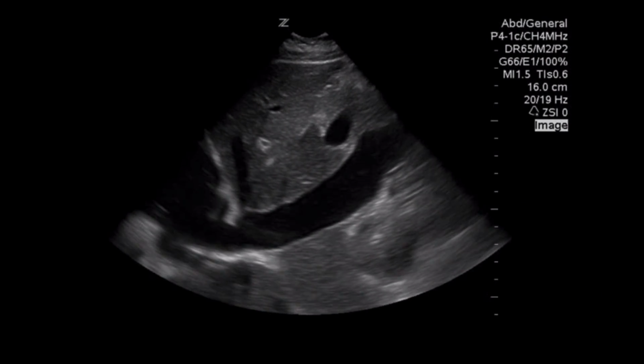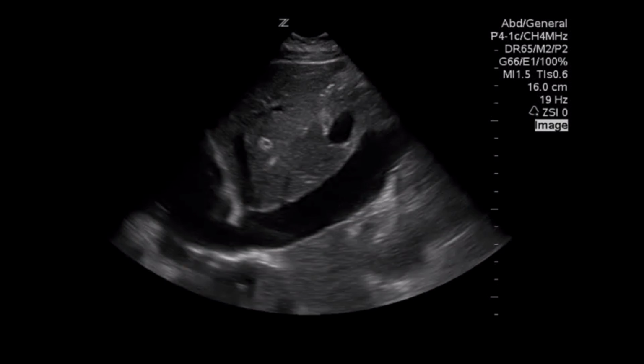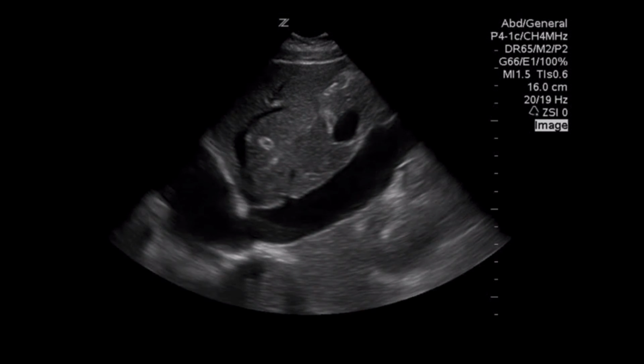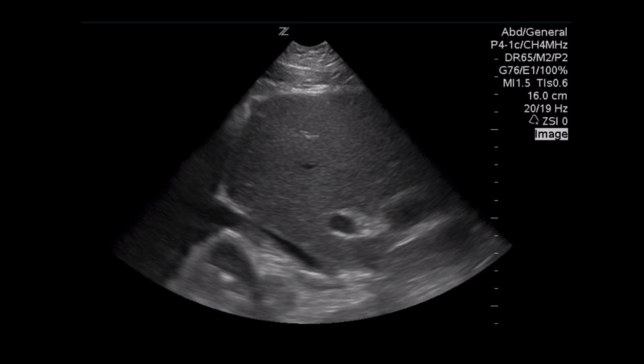Remember, the IVC is important because a very large IVC may be consistent with fluid overload or obstructive shock, whereas a very collapsible IVC would not be consistent with those diagnoses and more consistent with hypovolemia.